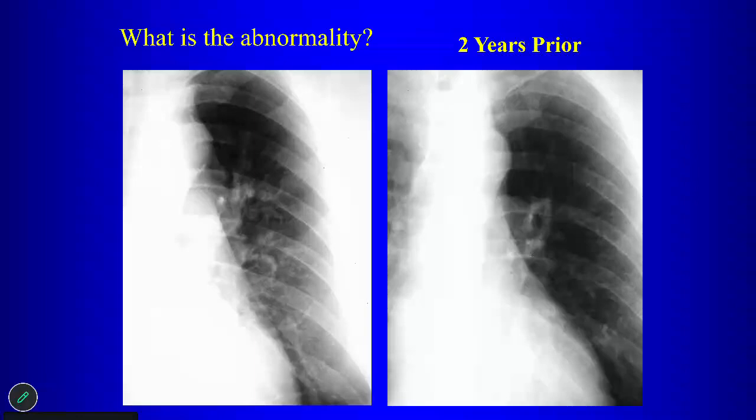Anybody? Bulging. What is this area in here? Oh, you're in pulmonary. What do you notice about the AP window on the current X-ray? There's something bulging out. See it? There's something bulging out of the AP window, right? So what is that something going to be?